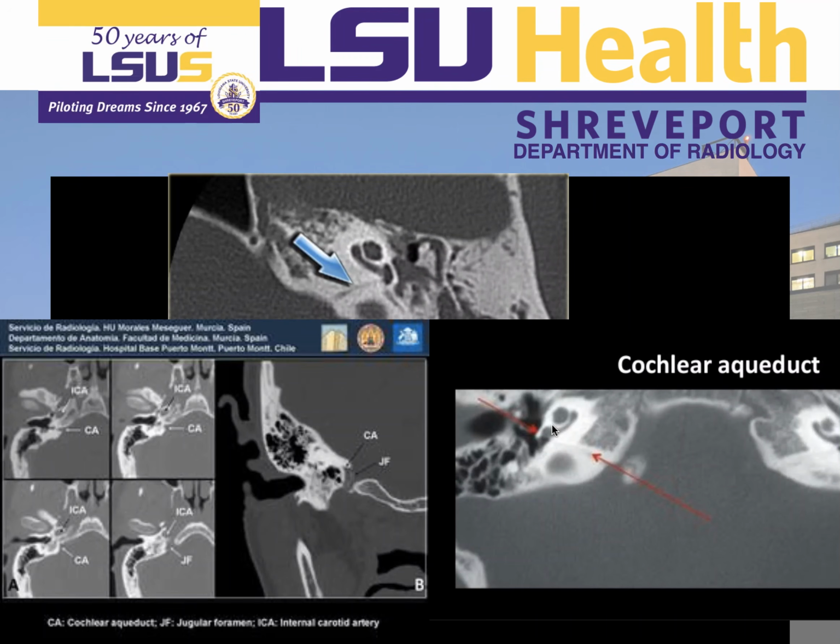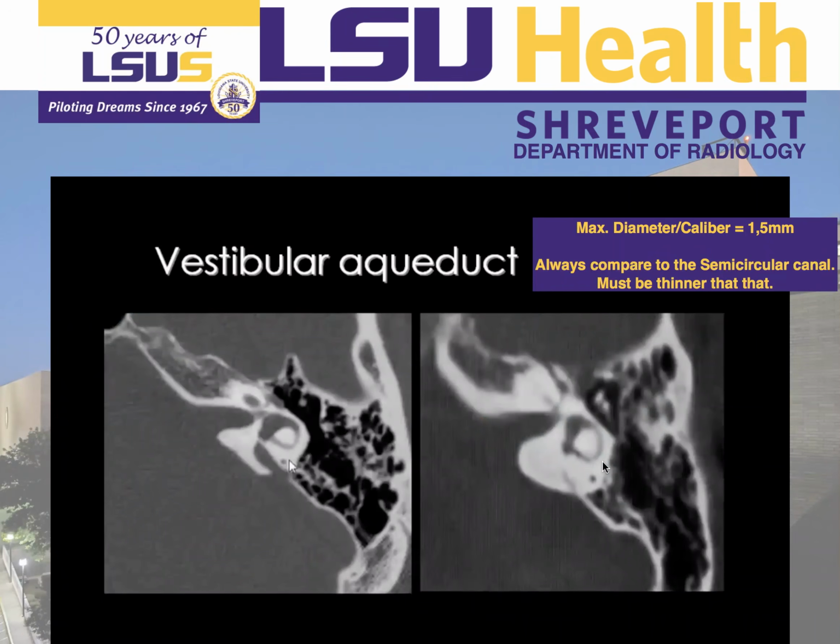Again, the cochlear aqueduct, you can see pointing towards the cochlea like a mini internal auditory canal, but inferior to the real internal auditory canal. This hair-thin structure is the cochlear aqueduct. And posterior, you can see this hair-thin structure that is called the vestibular aqueduct.